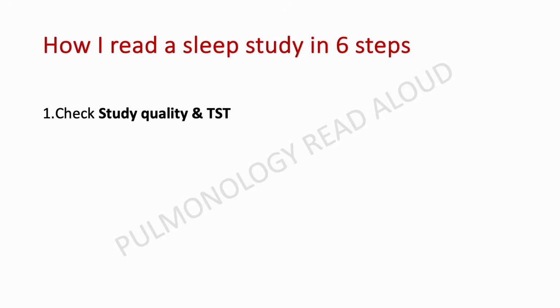Study quality is very, very important because a lot of times you may have had so many electrical disturbances and signals that you may not be able to stage the patient properly. The patient could have slept for a much lesser time and we may not have recorded the entirety of the sleep. For instance, he did not have any REM sleep at all. So if you are trying to score a patient for obstructive sleep apnea, you may actually underscore him. So it's very important to look that the sleep report has a good quality reading, and the total sleep time is at least 4 to 5 hours for you to go ahead and report that.